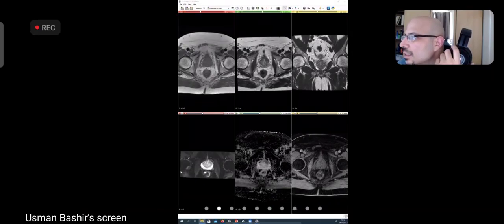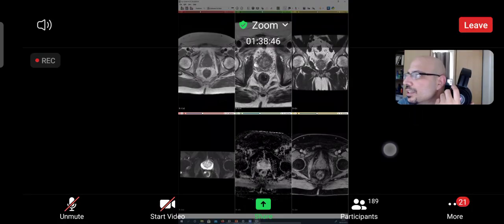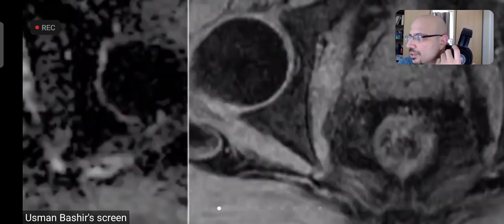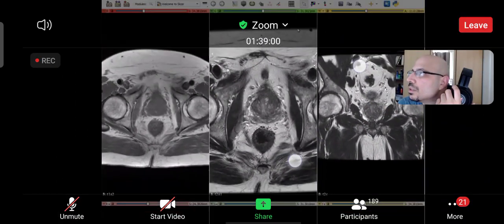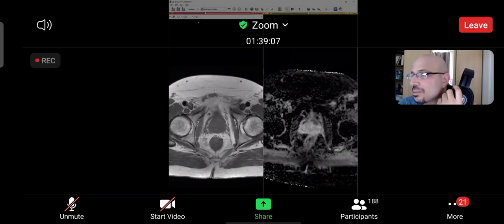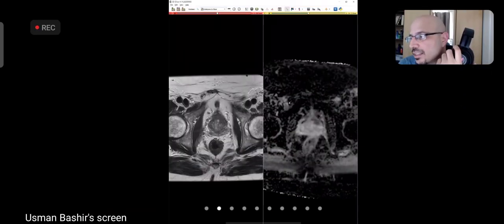ये देखें जी, ये एग्जाम्पल है कैंसर। और अब लोग सोच रहे हैं यार ये तो कह रहा था कि DWI का कोई इतना काम नहीं है ट्रांजिशन में, लेकिन इसका बहुत अच्छा दिख रहा है कैंसर DWI actually even better than T2. लेकिन मैंने आपको भी एक केस दिखाया जिसमें सिग्नल था डिफ्यूजन पे एबनॉर्मल, लेकिन वो उसको कैंसर नहीं था. So that's why it's not something you use in every case.